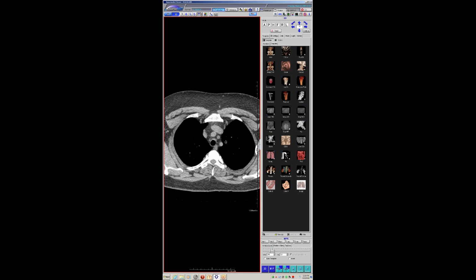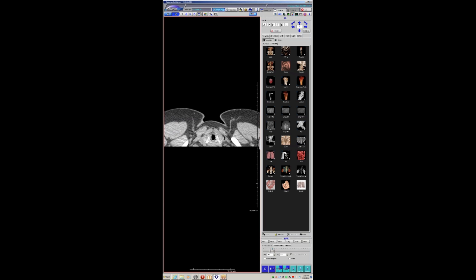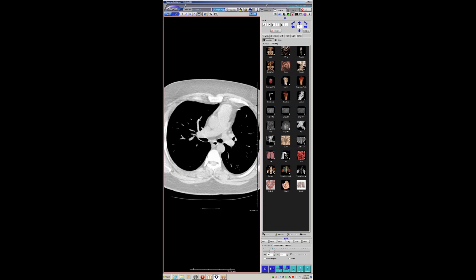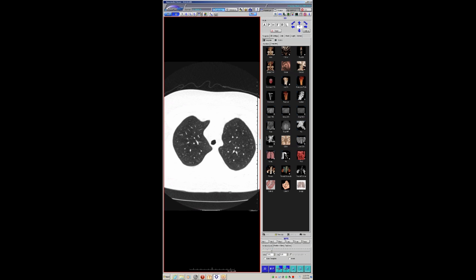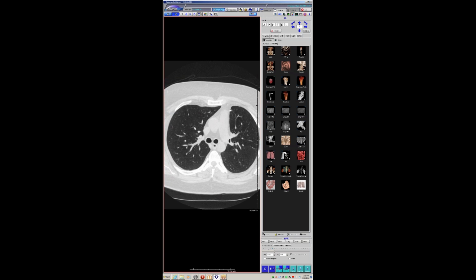Initially, I thought it was going to be something post-intubation, but looking up here, this irregularity, and then I looked up his history, and he had a history of GPA. And he actually has had multiple evaluations of his trachea by scoping showing ulcerations that have been biopsied, proving GPA.